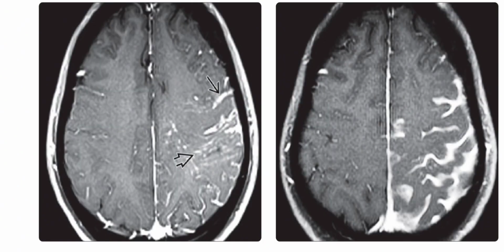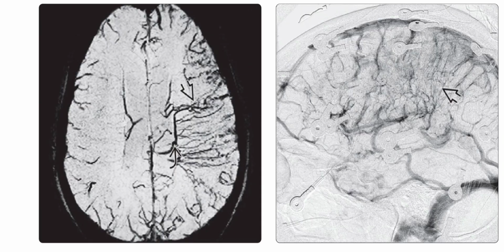Left is the more cephalad T1 contrast-enhanced fat-suppressed MRI sequence in the same patient, and it shows the enhancing pial angioma, which is filling the enlarged sulci. Also note the enlarged collateral medullary white matter veins that are draining the affected brain. Right is the T1 contrast-enhanced fat-suppressed MRI sequence in the same patient, and it shows the enlarged convexity sulci are entirely filled with the intensely enhancing pial angioma.